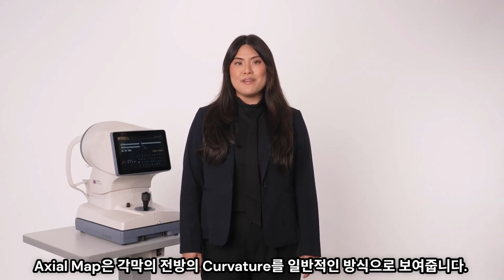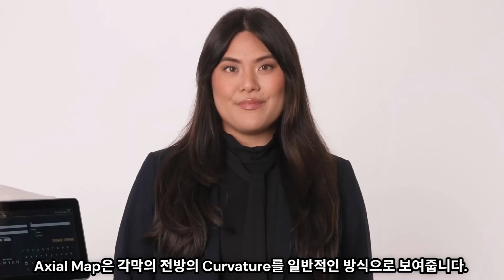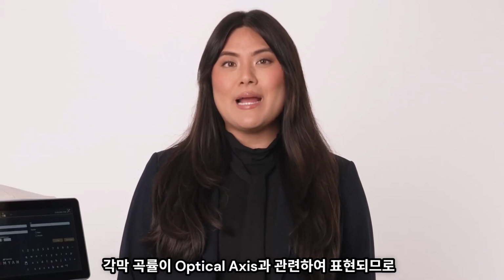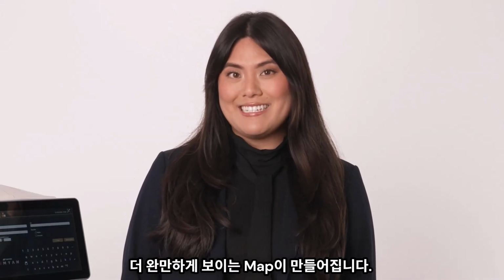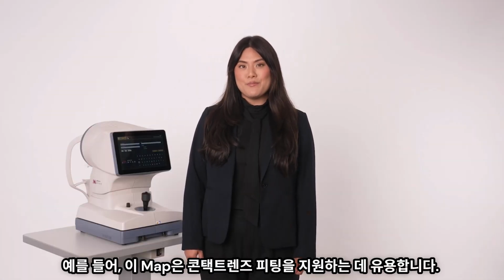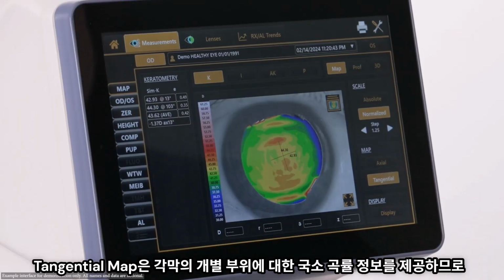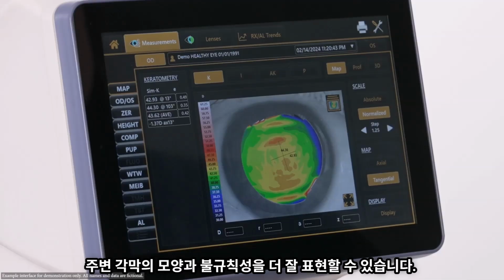Axial maps could be thought of as providing a general view of the anterior corneal shape. The corneal curvature is described in relation to the optical axis, resulting in a smoother map. For example, this is useful to support contact lens fitting. Tangential maps provide local curvature information about individual areas of the cornea and are therefore better at describing the peripheral corneal shape and irregularity.